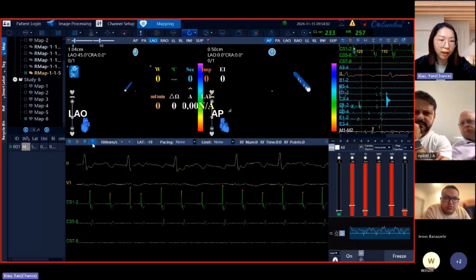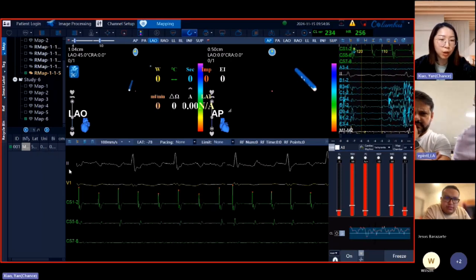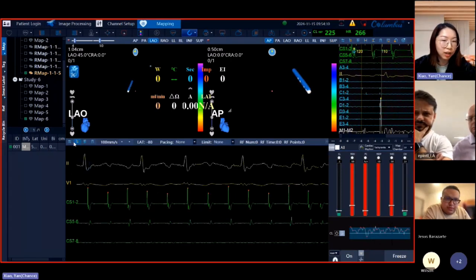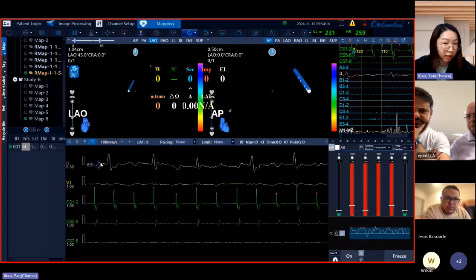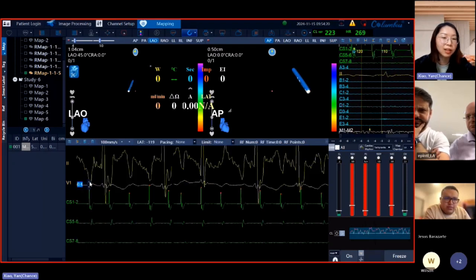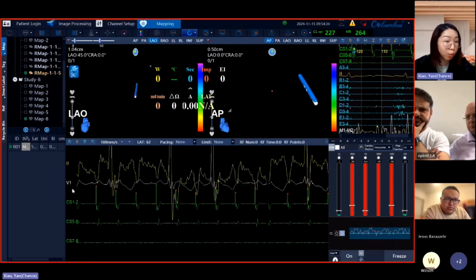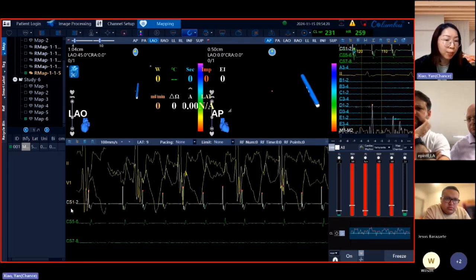Okay. And if you want to modify the amplitude, you can also left click at the same position. Actually, it's still here. If we have this value, we just left click and modify it. But without this, you can still click at the same position and modify it. You see?